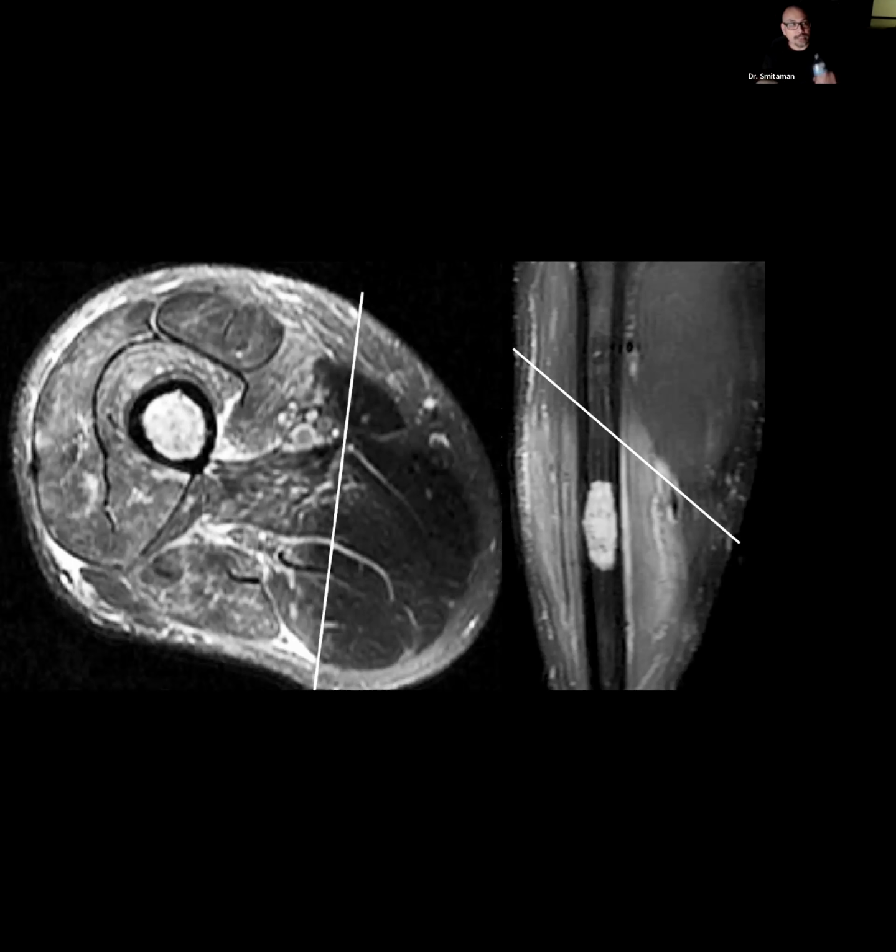Moving along with edema, sometimes radiation can cause muscle edema, and that can lead to radiation-induced myositis. This can also cause intramuscular septal edema related to radiation-induced vasculitis, and the signal change can persist for years. Radiation-induced changes should be considered when you have a sharp band-like demarcation, and I dropped a line here between abnormal and normal signal, especially if you have an interface such as this within a single muscle.